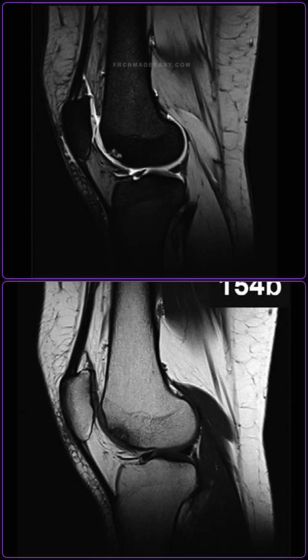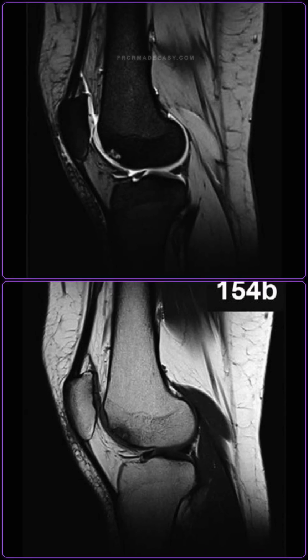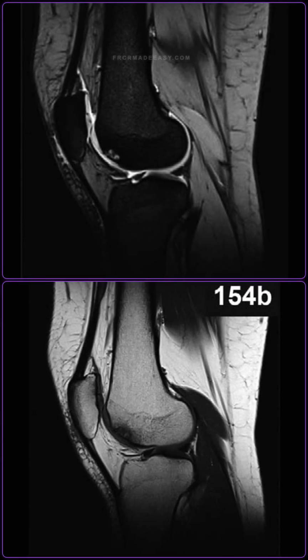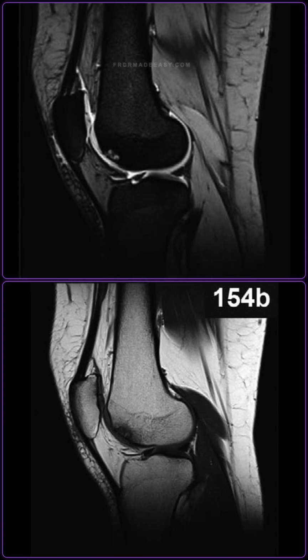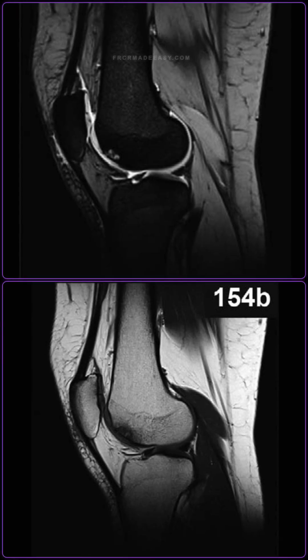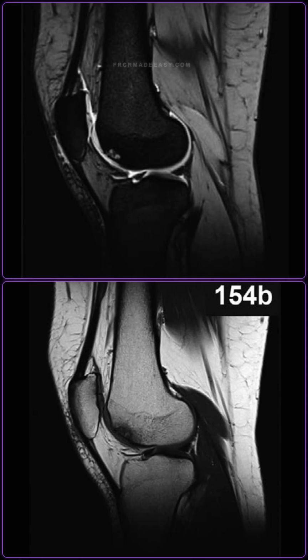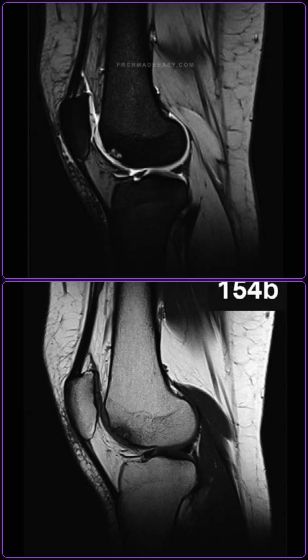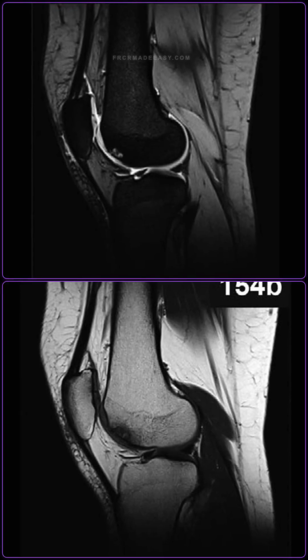I am showing you the sagittal T1 and T2 weighted magnetic resonance images of the knee. Describe the findings. The sagittal T1 and T2 weighted magnetic resonance images of the knee demonstrate a traumatic osteochondral fracture along the anterior aspect of the lateral femoral condyle. There is a small osteochondral fragment that is mildly displaced, surrounded by a rim of high T2 signal fluid.